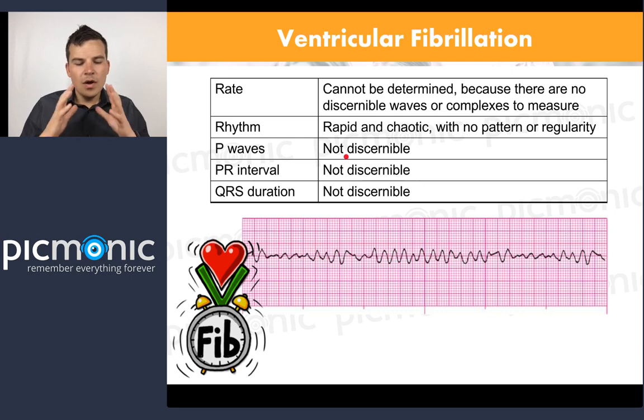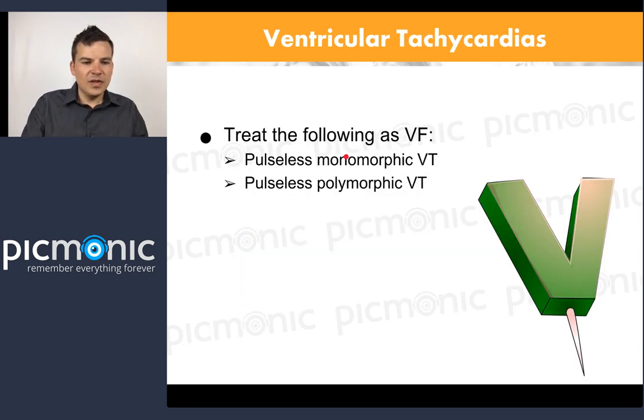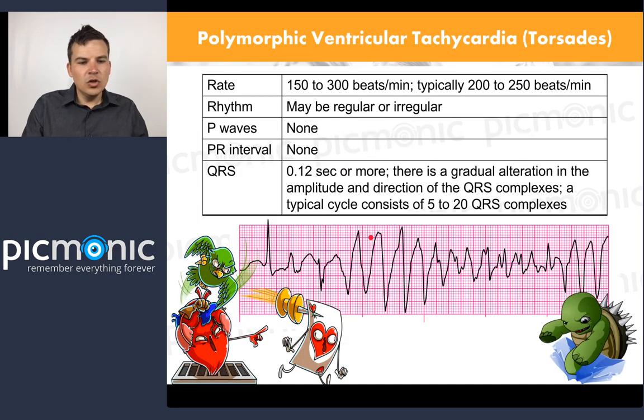What's important here is that there is no discernible pattern at all, ever. Now, if I go backwards and look differently at polymorphic VTach, look at these giant, beautiful waves in here. I mean, these are beautiful, giant VTach waves. VTach waves always look like this. Well, not always. They can be a little shorter. They usually look like these short, fat ones, or these big, beautiful, tall ones. And that's not a discrimination joke against short, fat people. I'm short and fat.